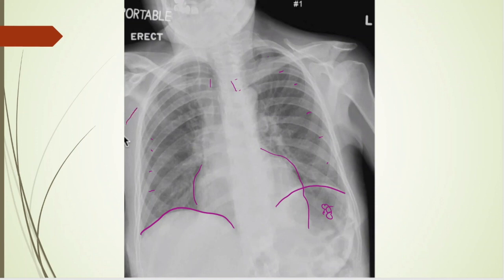It comes from here, but it goes up into the patient's neck, so that's not good. And we all know PICC lines can do that. Also, subclavians can do that. So this line needs to be withdrawn and then readvanced and hopefully go the right direction this time. That's all I see on this chest x-ray.